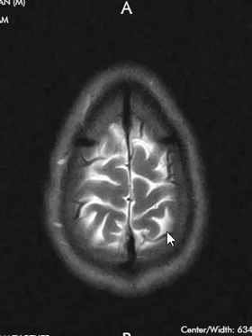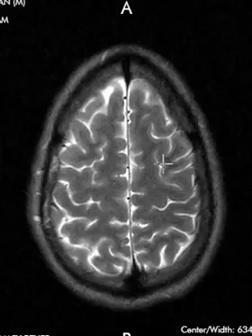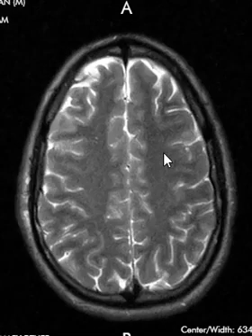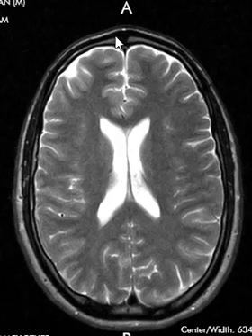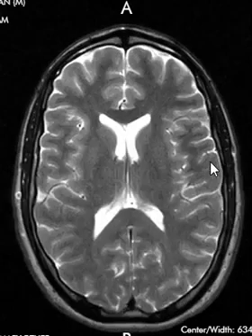Now if we change orientations, this is that same sequence where we see fluid is really white and the brain parenchyma is more dark and gray. And we're going to go down from the top, down, down, down. Now we see the front is over here, the back is over here. This is the right side, left side. And this is what we call an axial image. We're slicing going down, down.